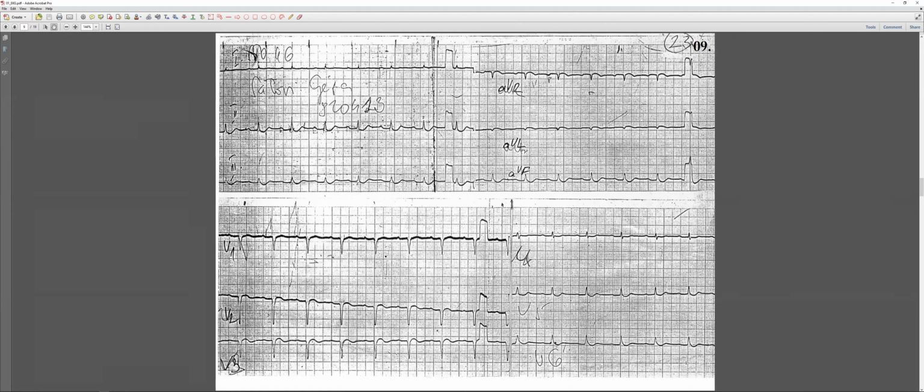And let's look at the PR interval. I'm trying to look where it looks best, maybe here. So it seems to me a little bit long. So I'm suspecting AV block type 1, first degree, sorry. Yes. The QRS seems narrow to me. Me too. So now let's look for a pathological Q wave.